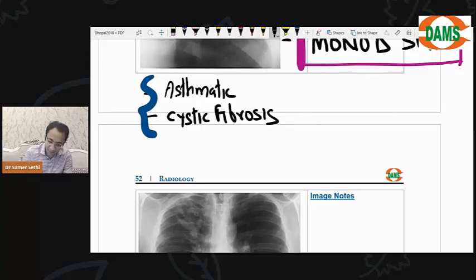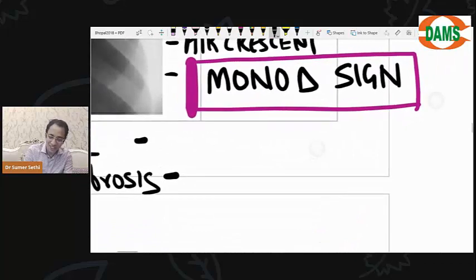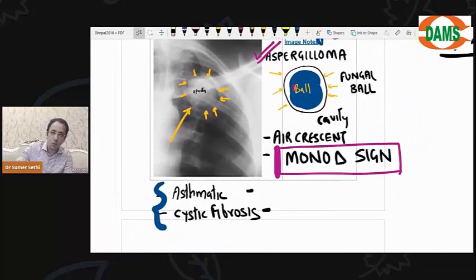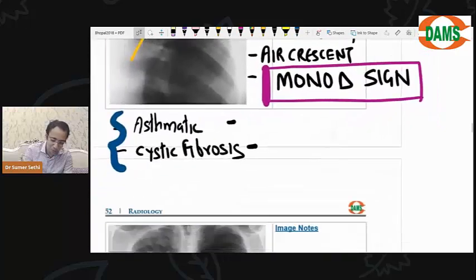These patients, okay, I will not repeat this sign, beta Janvi, otherwise you will make fun of Binod. Okay, I'm repeating. The sign is Monod sign. In a fungal ball, you will see a crescent of air surrounding it. That is called the Monod sign. This is not Binod. Okay.